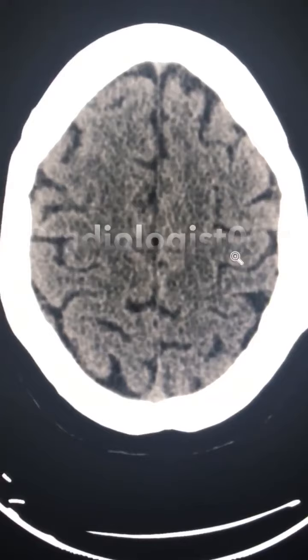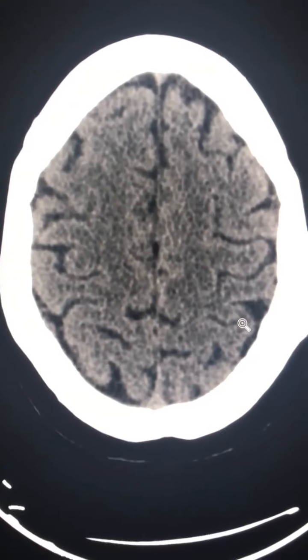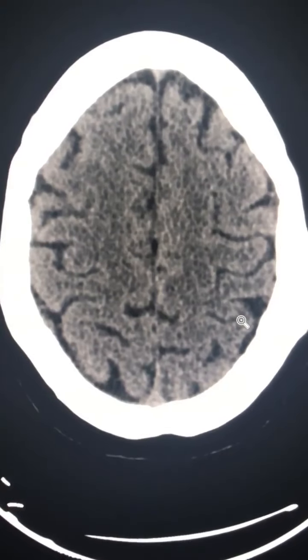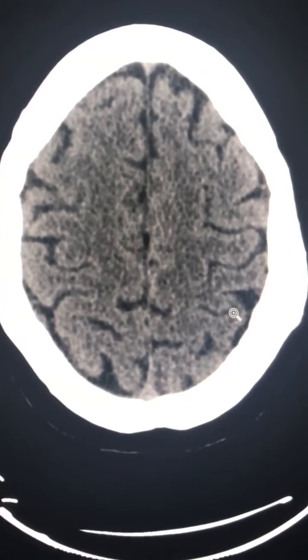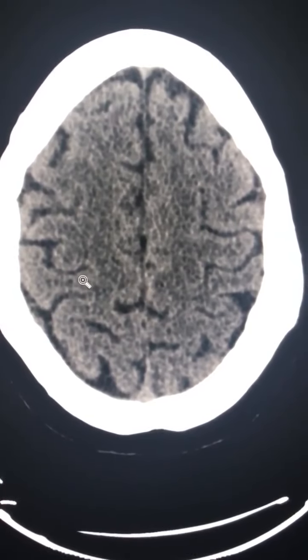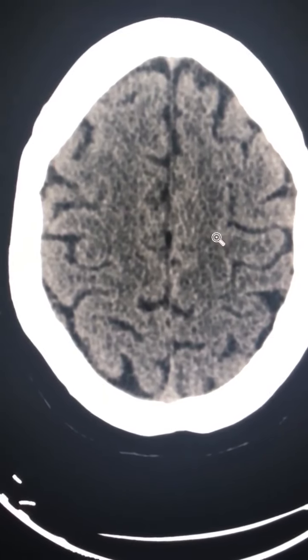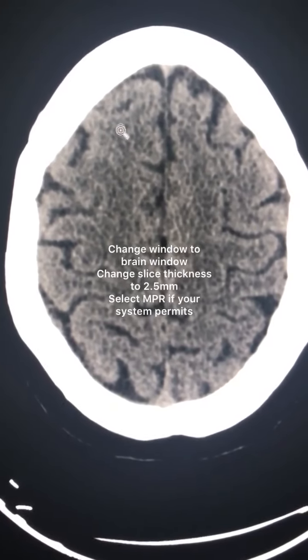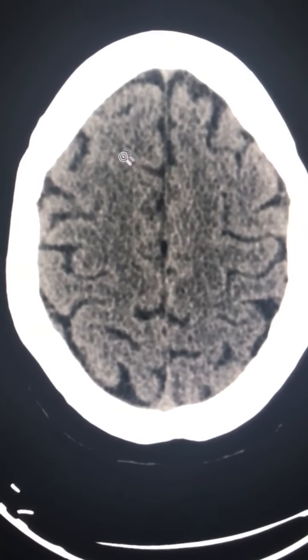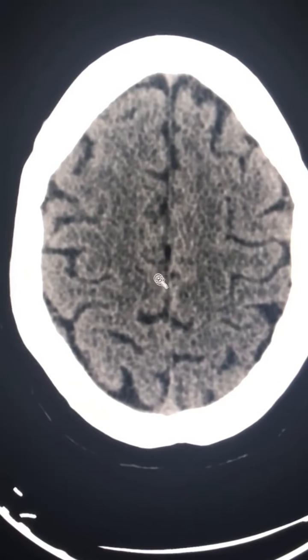How to report a CT head scan. Normally, CT head is a non-contrast scan mainly done for a stroke or any head injury to look for any intra-axial or extra-axial bleeding. So before we start reporting, we have to make sure that we increase the slice thickness to 2.5 millimeter and change the window to brain window.